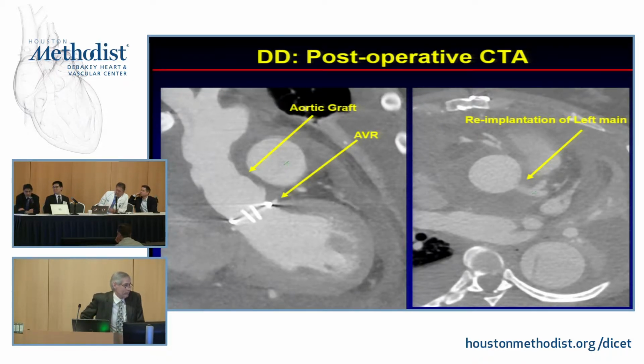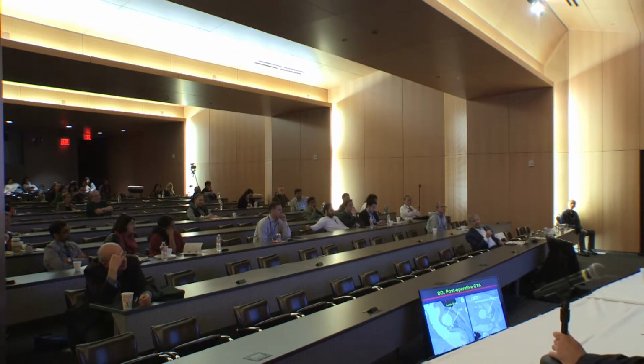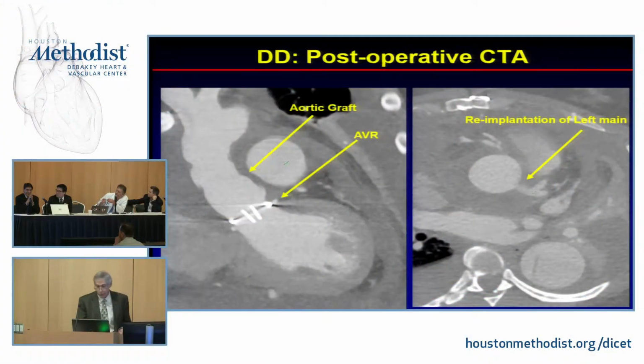Comparing with the aortopathy and the history of dissection, the big leak, this is a bicuspid valve. I think this patient did have a bicuspid originally. This patient is lucky to be alive, right? With a type 1 dissection. These are the patients you don't want to leave alone. You'd like to keep close follow-up after that initial dissection. She may not have had it, but you'd like to keep in touch. It's kind of interesting, she did present with chest pain, and her left main was extremely stenosed.